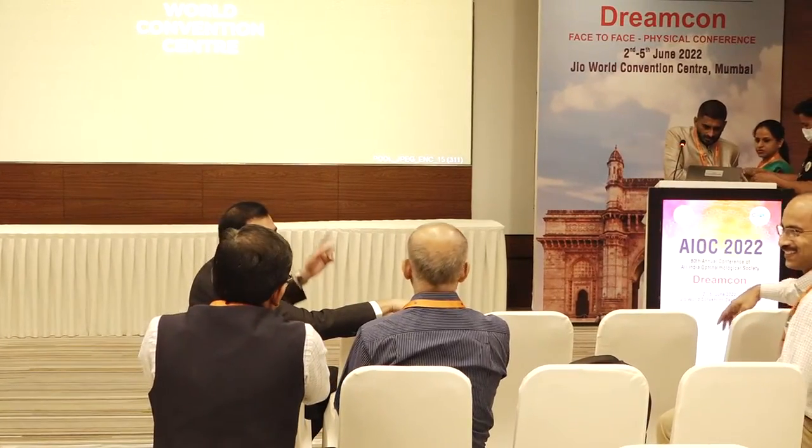Yeah, and multiple pathologies can coexist. Even the coloboma disc can develop glaucoma. I got this case 3 days ago. So it was good for us. Opportunity, Shweta.